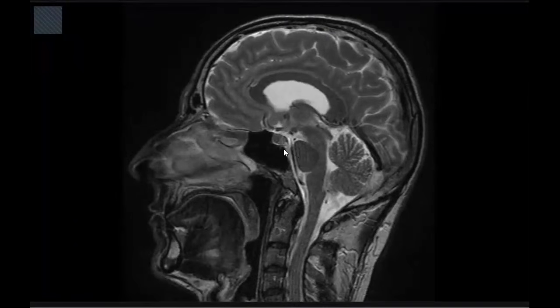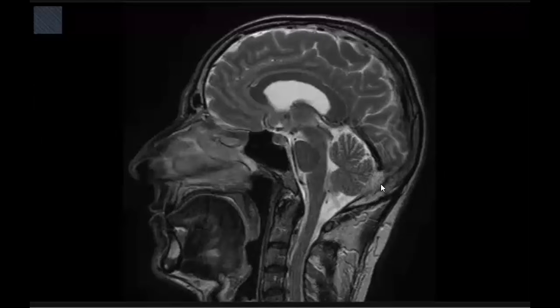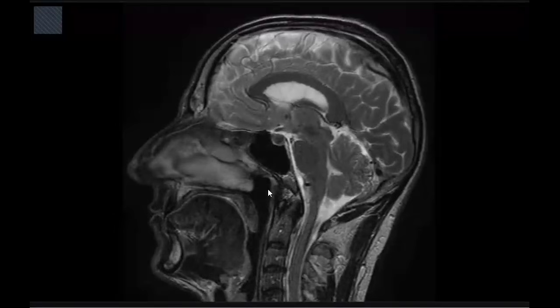This will differentiate it from hypertension, which will show a partial empty sella. And you can ask for the cause. You can do a whole spine MRI or ask for any previous operation or lumbar puncture, because the causes of intracranial hypotension may be idiopathic, or secondary to any previous injury to the dura or CSF leak. And as you told, we will refer this patient to a neurosurgical team if there is any primary cause, or a neurology team if it is idiopathic.